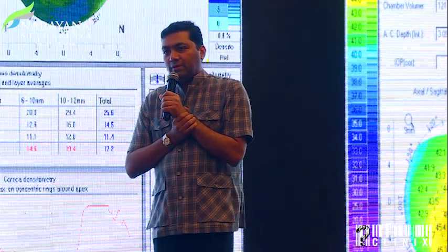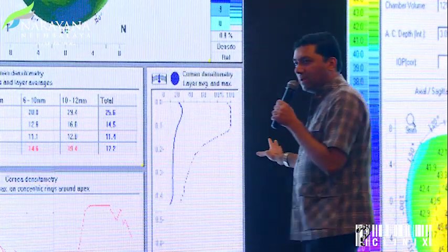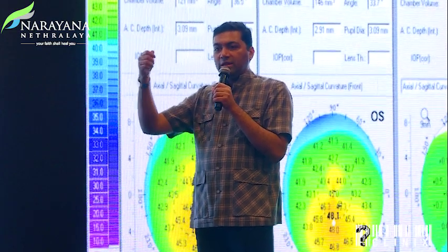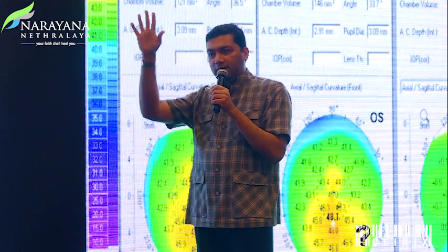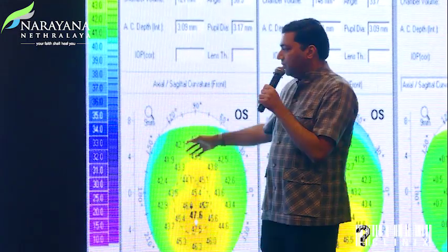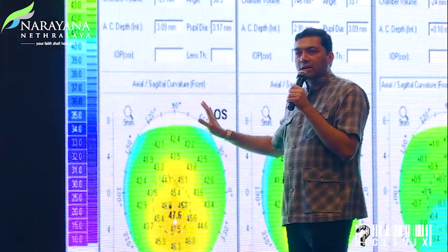If you don't have it, then we still have to use these parameters like all of us at this point of time. And in his, he's made it easy, including visual acuity, best corrected, and all of them are included, so it makes it easy. Otherwise, we'll have to go scan by scan like what we said.